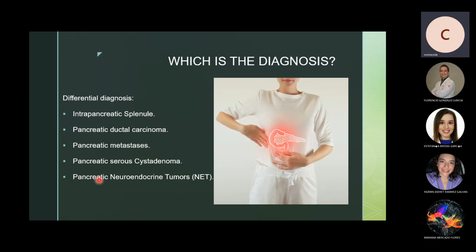The pancreatic serous adenoma has a classic microcystic or sponge appearance, with a lesion consisting of many small cysts with enhancing septations. This finding is not comparable with our case, so this is not the diagnosis.